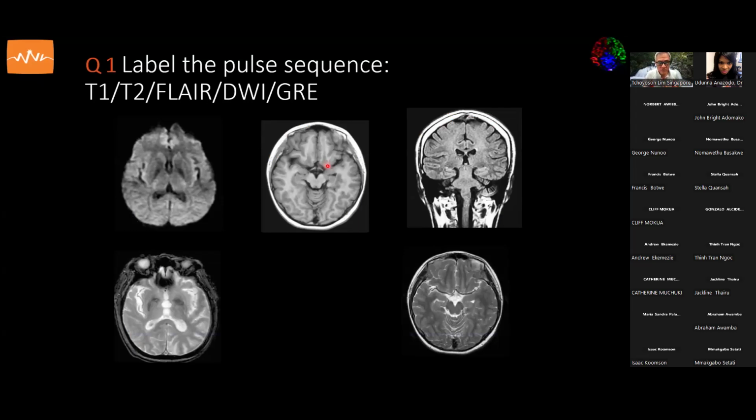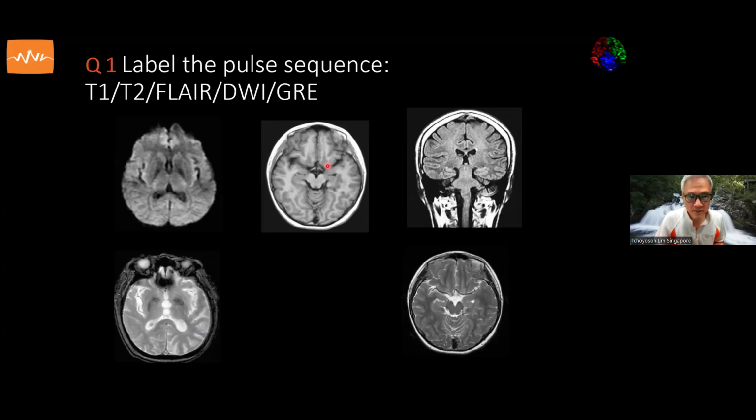And these are the pictures I was talking about earlier. Each of these pictures represents a particular image from a pulse sequence, which you should be familiar with if you've had practice hands-on. If you haven't, we will go through some simple methods of identifying whether the correct picture is appearing at the MR console a little bit later. So each of these pictures is a different pulse sequence, and that's the beauty and the magic of MRI.